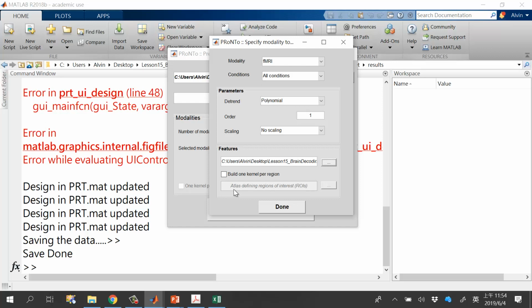So we use the whole brain mask as the first masking to get rid of the background voxels. But then right here, we further use the Fusiform gyrus mask to extract only the voxels from this Fusiform or FFA area right here. And you can see there is another option right here, that you can use the atlas-based ROI.